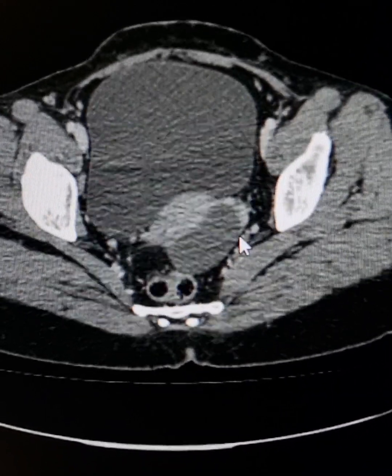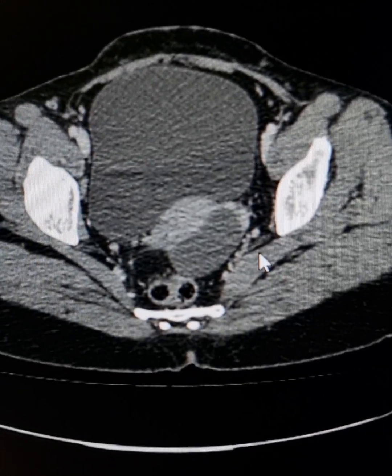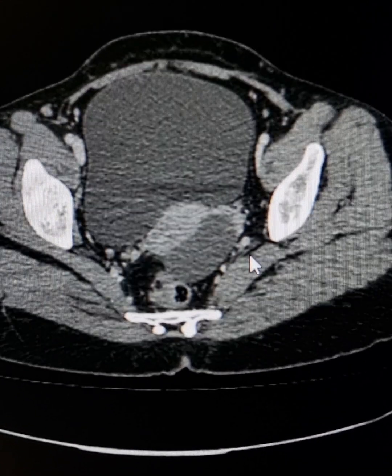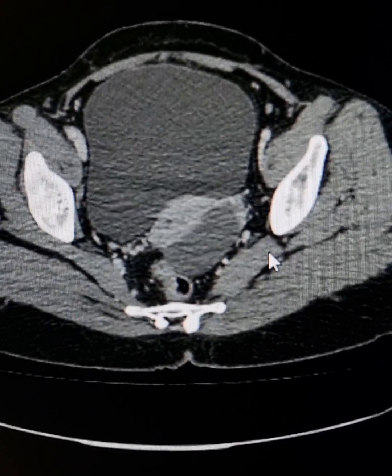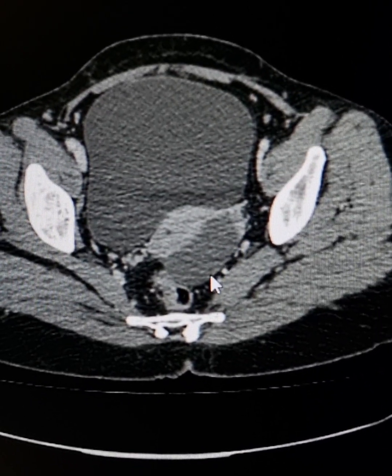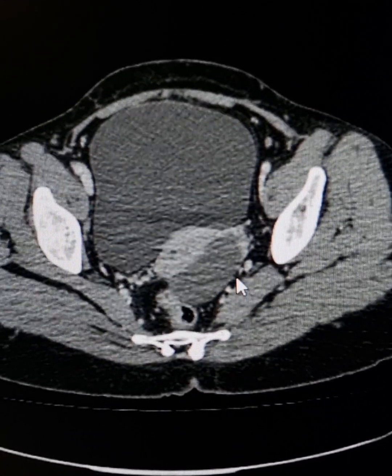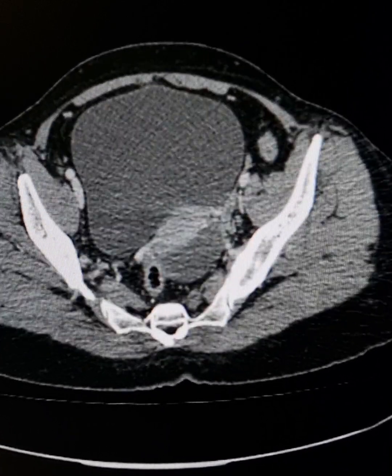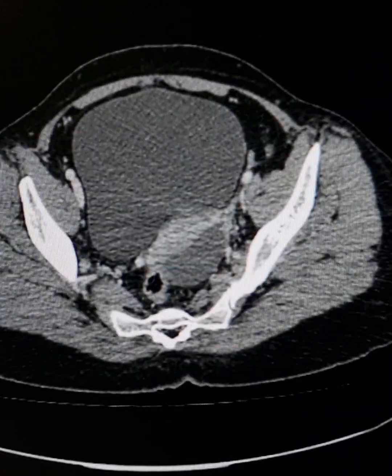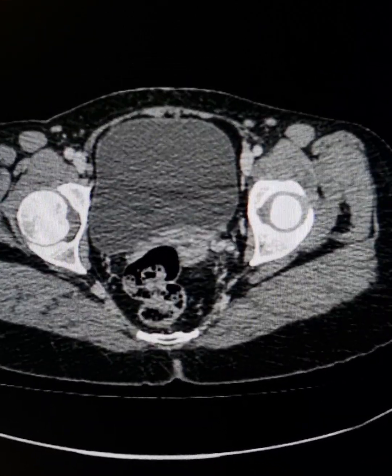So this is quite typical of follicular cysts. If they are complicated cysts, that means either infection or intracystic hemorrhage, or it's an endometriotic cyst, then the walls are usually a bit appreciable, or they are moderately thick walls and they do enhance with the contrast medium. So preferably we would label this as a follicular cyst.